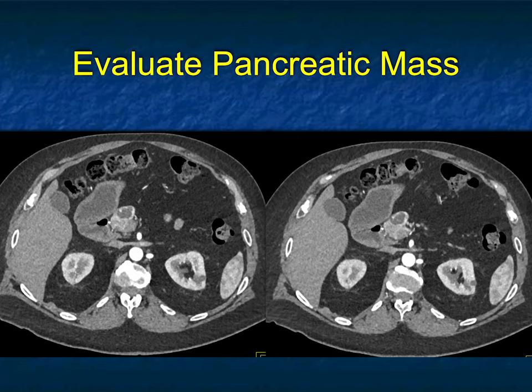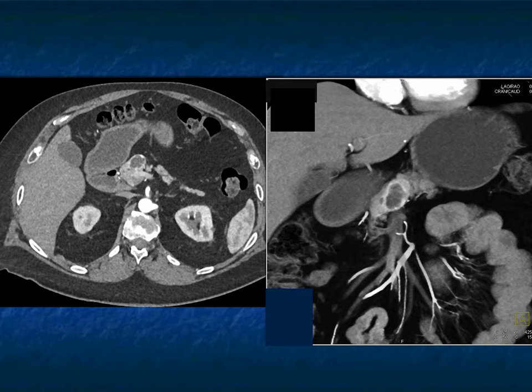Another case, cystic lesion, head of pancreas, rim-like enhancement. When I see an enhancing lesion with rim enhancement, I'm always thinking of neuroendocrine tumors. I could also be thinking about metastasis, but it's not going to be adenocarcinoma. It's not the look of an MCN or serous cystadenoma.